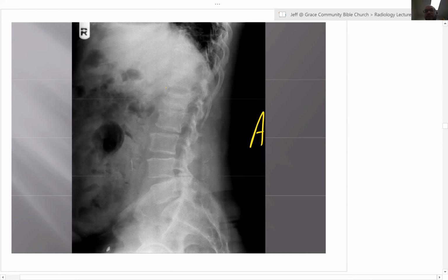Okay. If you see sclerosis underneath the superior end plate and a step off that corner of the end plate, that's radiographic evidence of an acute compression fracture. So we know what a pathologic compression fracture is by way of reminder. You know, the bone density is bad, then we're worried, and we have a history of cancer. Here we have trauma, and we have a step sign and a zone of condensation, which indicates an acute compression fracture.